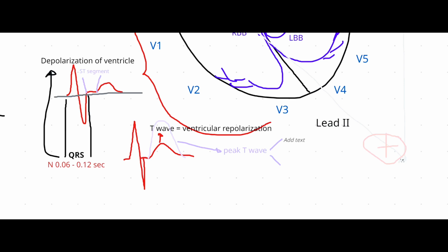Because potassium is intracellular, and so even during rest, you're seeing that high level of potassium in the myocardium, okay? In all the leads, you're seeing them all peaked. As opposed to if it's localized, meaning it's only in V1, only in V5, only in V4. Only a few precordial leads. Okay, so that's from V1 to V6.